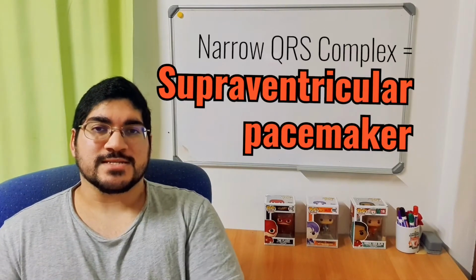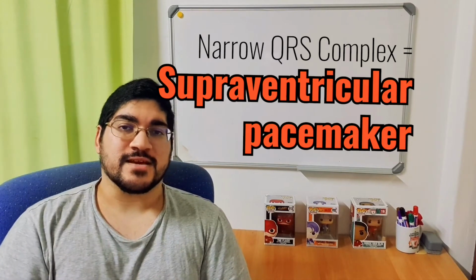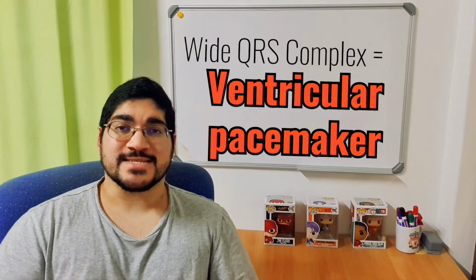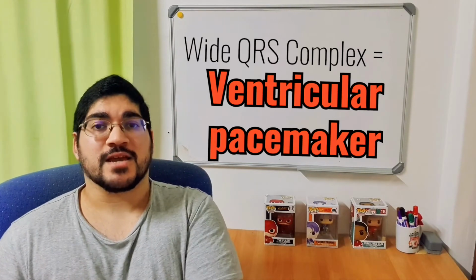Now why do we need to know whether a QRS complex is narrow or if it's wide? What important information does that give us? It tells us where the impulse is being generated. A narrow QRS complex means the impulse is being generated above the ventricles, so it's called a supraventricular tachycardia. Whereas a wide complex tachycardia means that the impulse is being generated somewhere in the ventricles. It can be anywhere along that path in the ventricle, but it's a ventricular tachycardia. Narrow complex tachycardia is atrial tachycardia or supraventricular tachycardia, whereas wide complex is ventricular tachycardia. It means that you're looking at different causes for the two types.